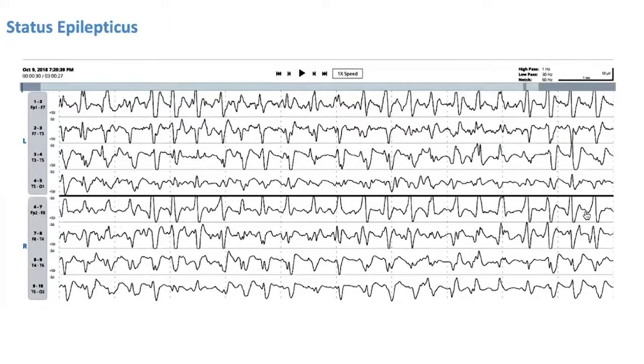Generalized seizures may have the slow wave still present, but there's no clear normal activity between the spike and slow waves. And so it becomes a succession of these discharges, which if they occurred at one time would be interictal, or between seizures, but because of their linking of one to the next, become an ongoing state of seizures, a status epilepticus. Knowing how this changes over time is still useful, but looking at this page would be very concerning that I'm seeing only epileptiform abnormality.